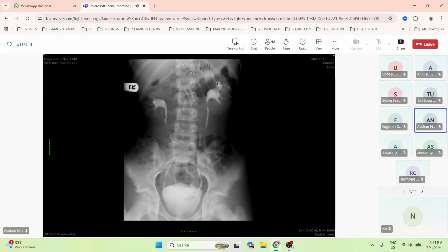You see a faint dilated upper moiety here. See? Delayed excretion because it's obstructed, because there are two ureters here. See, there's a ureter there, right? So it is excreting, but it's delayed and dilated. Okay. So now you know on the left side, there's a duplex collecting system with an obstructed upper moiety and a ureterocele. Okay. What about the right side?